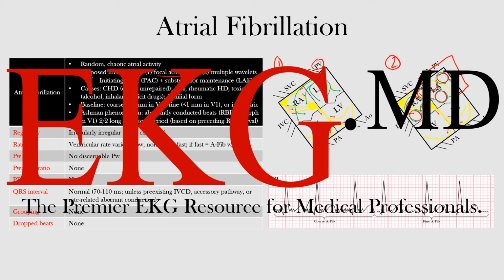All right, so now on to the EKG features. So what can we see here? Well, on the EKG, atrial fibrillation appears as if there are no discernible P waves, and the QRS complexes are activated haphazardly. Therefore, we call this an irregularly irregular rhythm. The ventricular or QRS rate or response is based on the occasional activation from one of the pacemaking sources in the atria. And because they are not paced by any single site, the intervals and complexes are completely random, irregular, and can be slow, normal, or fast.